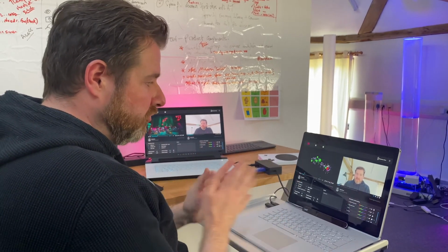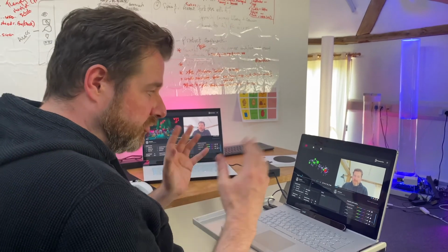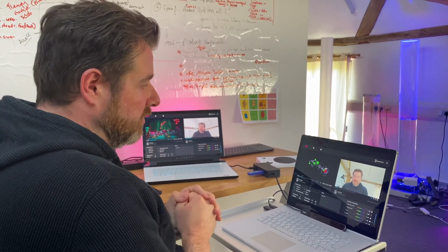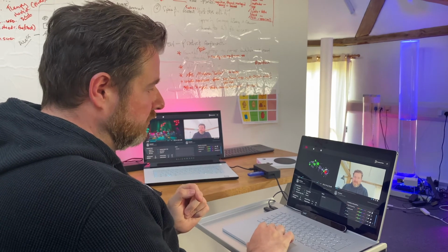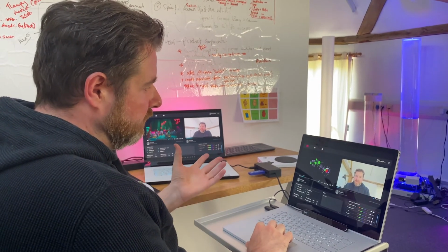Obviously there's a whole bunch of more complicated things that I can go into more detail about, but that's just a quick overview of what you're seeing here with regards to the bubble scene that we've loaded up.